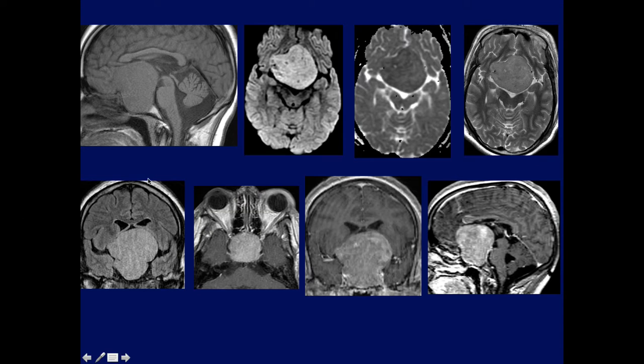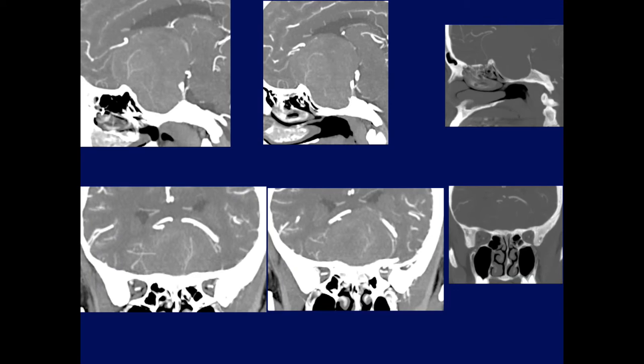I think that the main finding here, there's enhancement, which both of them can have. I think the diffusion image showing the marked restriction would go more for meningioma, which many times will be quite restricted on diffusion. The patient then underwent a CTA, and the CTA was read out as not likely to be meningioma because there was not this typical marked enhancement.